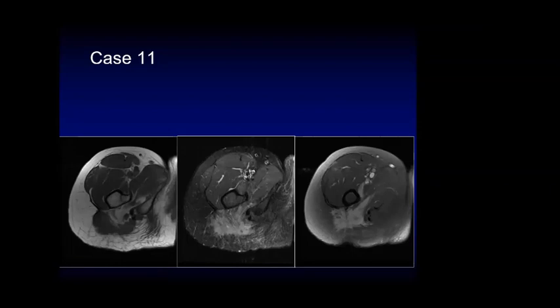Maybe ischiofemoral impingement between these. Honestly I don't remember, I think piriformis or quadratus femoris. Just abnormal signal intensity. So quadratus femoris is actually here. Yes, this is the hamstring origin. Okay, this is ischiofemoral impingement.